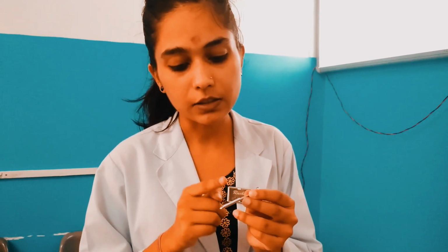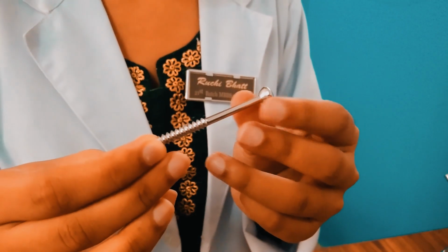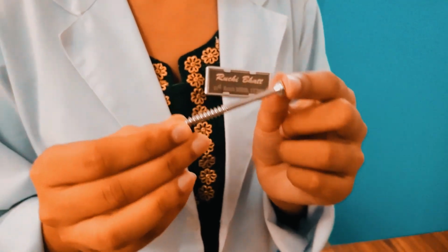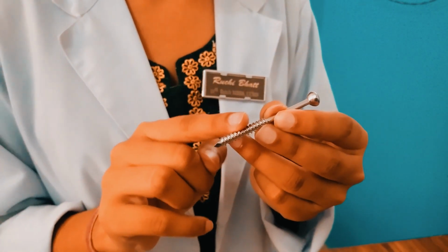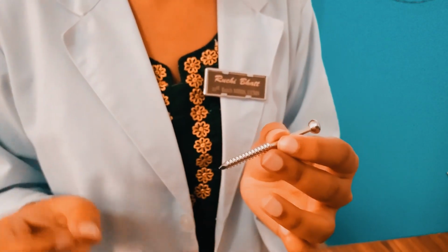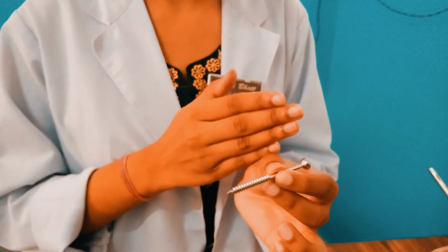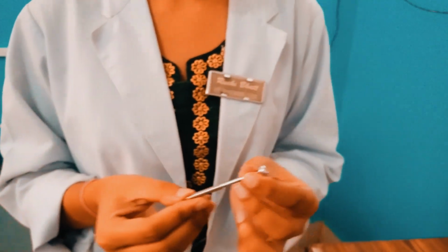The region from where the thread starts is always behind the fracture line. The shaft does not take any purchase, so there is no resistance from it. Due to this, the interfragments distal to the fracture line are compressed towards the main fracture line, toward the proximal side of the bone, and hence compression and stability is gained.